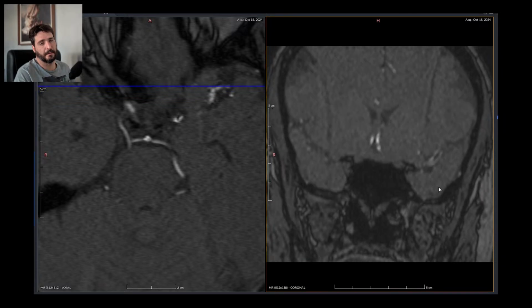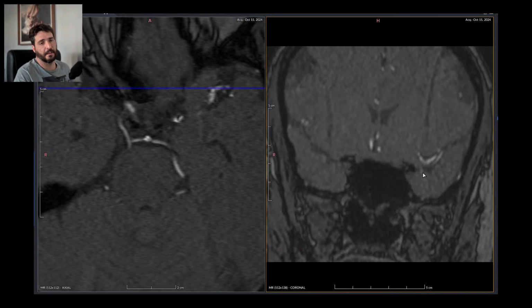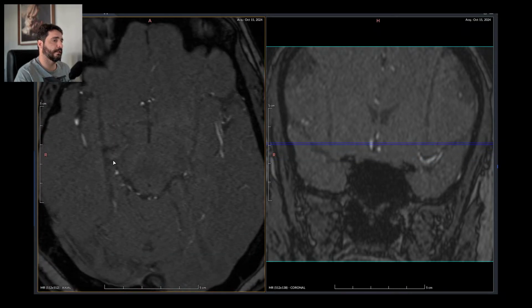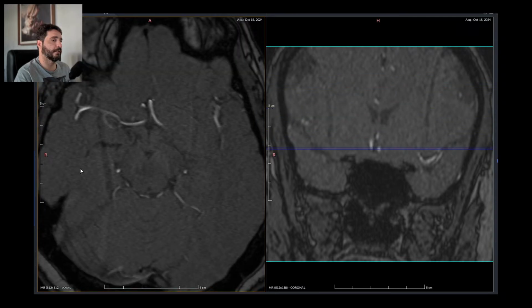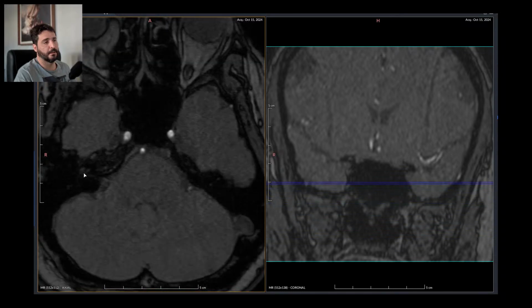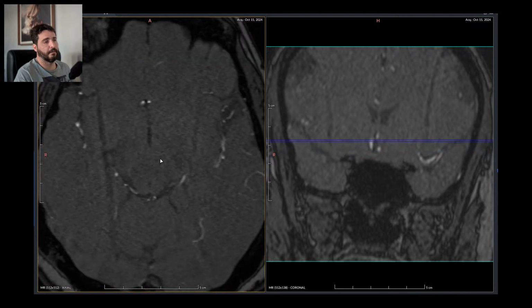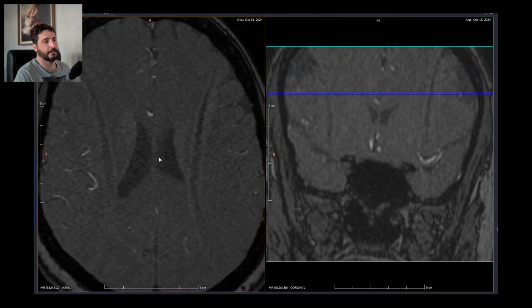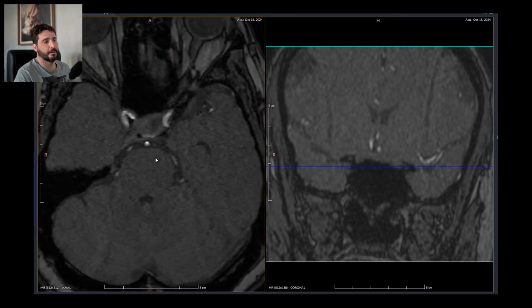blurry and blocky, so it's useless. I can't really say much about microaneurysms here. So this is a completely useless scan. This is just to make a fool of the patient. I'm just going to be clear on the report that the artifacts are very bad for any kind of proper report. Can't really do much.